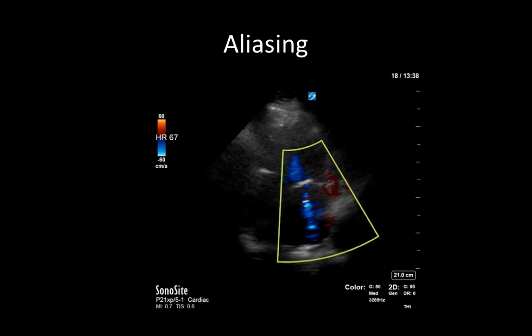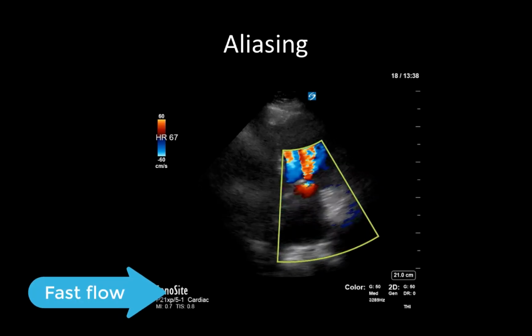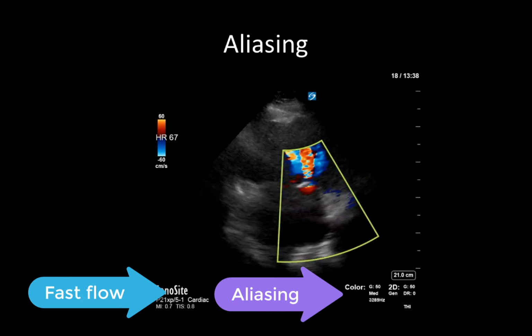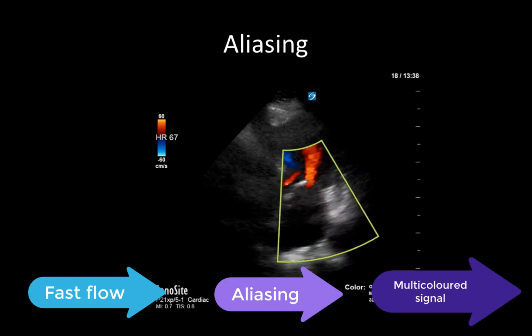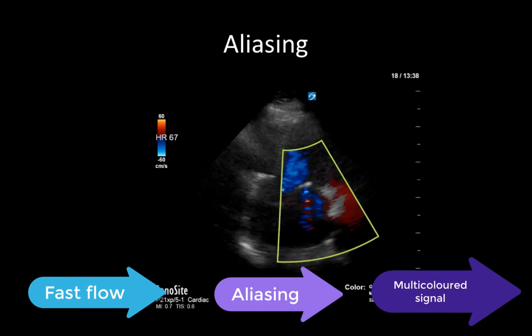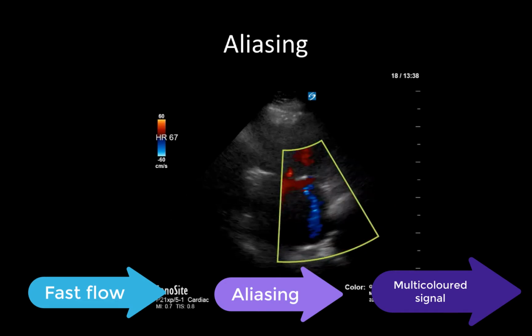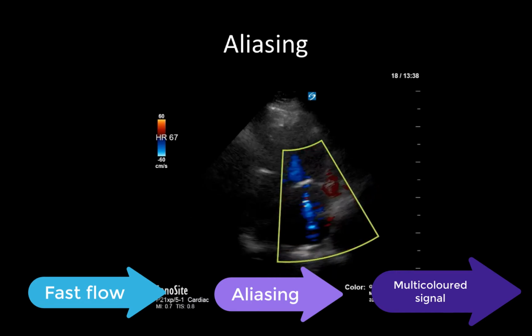So as we mentioned before, color Doppler is subject to aliasing, just like pulse wave Doppler. However, we often make use of aliasing in color Doppler to help us identify areas of very high velocity blood flow. In a color map, aliasing is represented by a mix of yellow, red, and blue colors. And it takes on all these colors due to the machine senselessly plotting directions of flow, as it is unable to resolve their direction, given that they exceed the Nyquist limit.